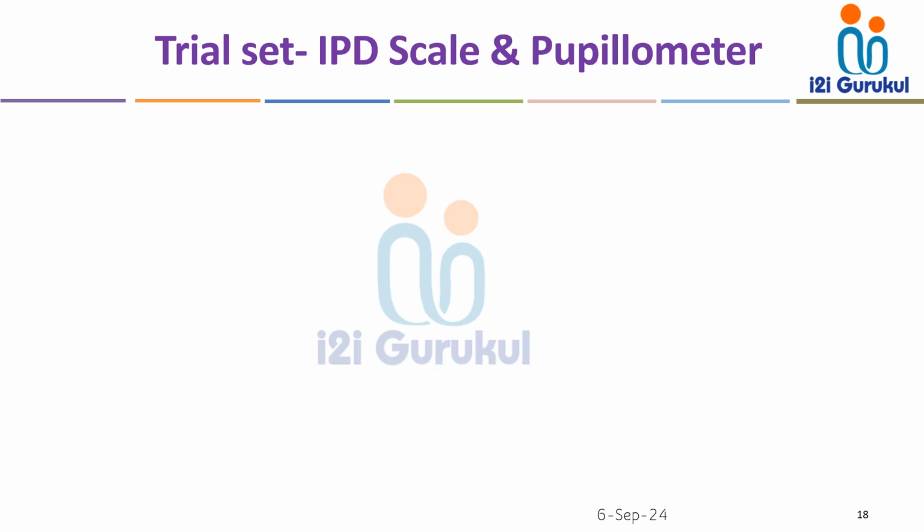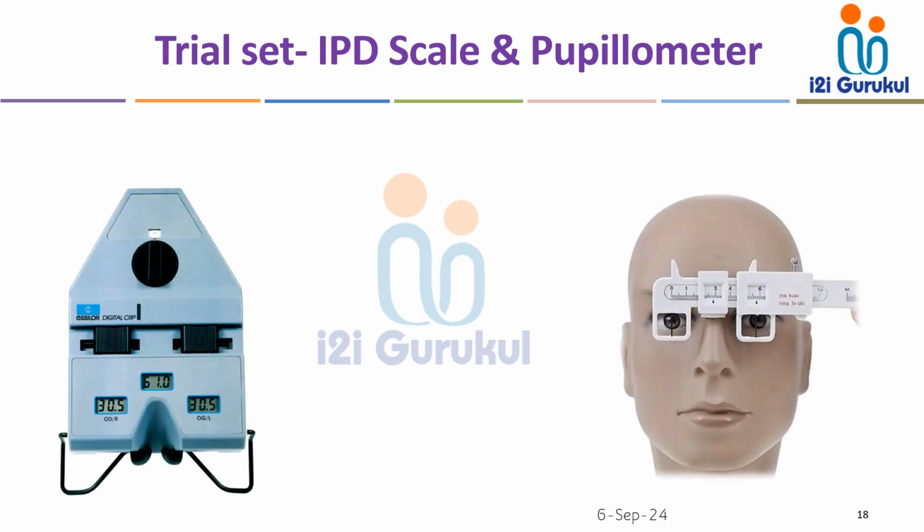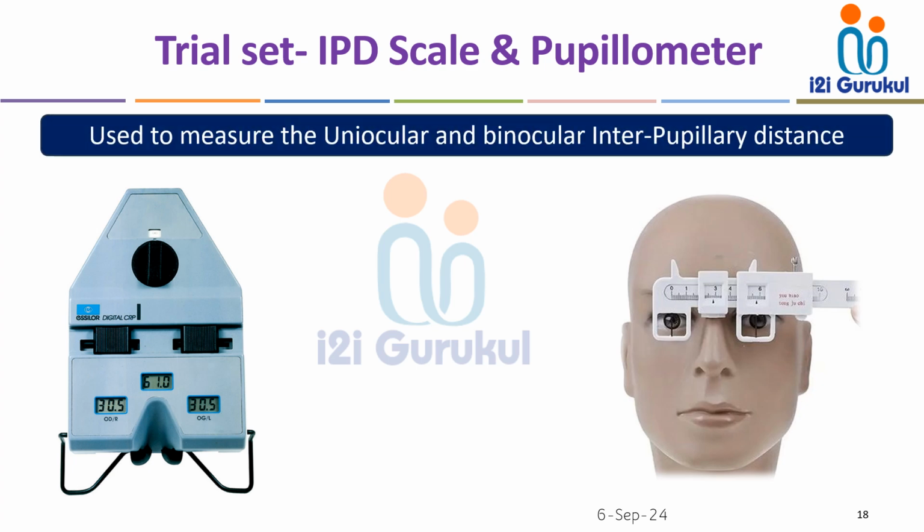Now we'll see the IPD scale and pupillometer. You can see in the image that the right side image is showing the PD scale and the left side image is the pupillometer. This is used to measure the monocular or binocular interpupillary distance. Before you put the trial frame on a patient, please measure the patient's PD using a scale or a pupillometer.